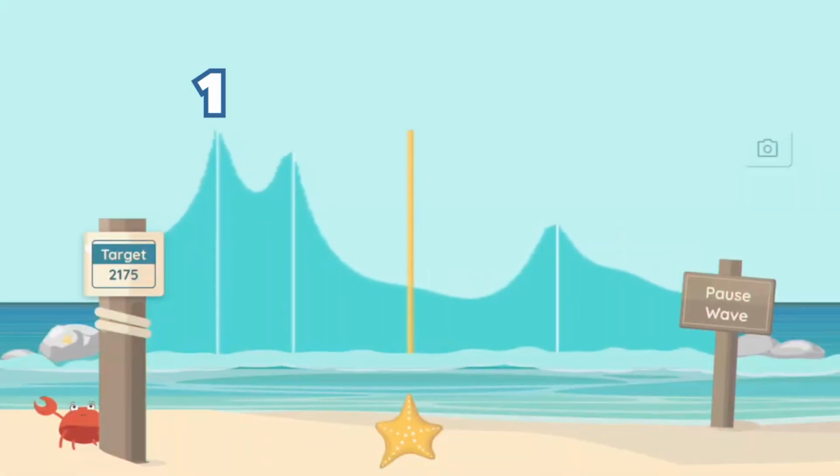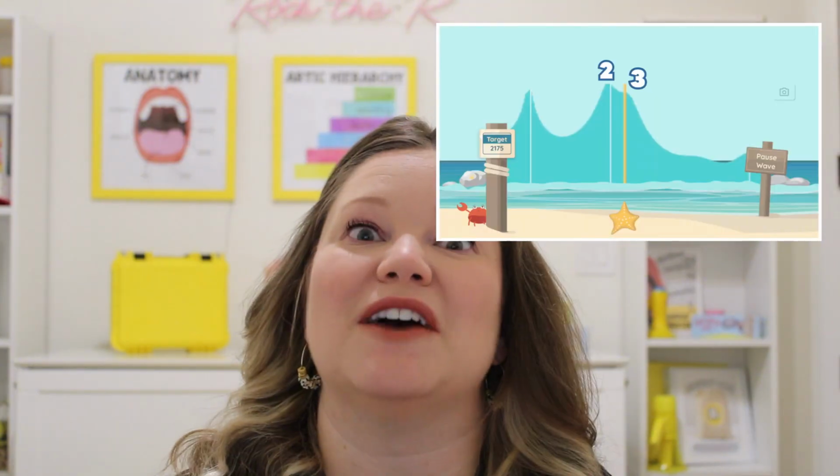When you make a sound in free play, you're gonna see 3 main peaks. The third peak is what we're paying attention to for the R sound. Your goal is to make the second and third peak frame the Starfish Slider. So when your wave looks like this, it means you have an accurate R sound and not just an approximation.